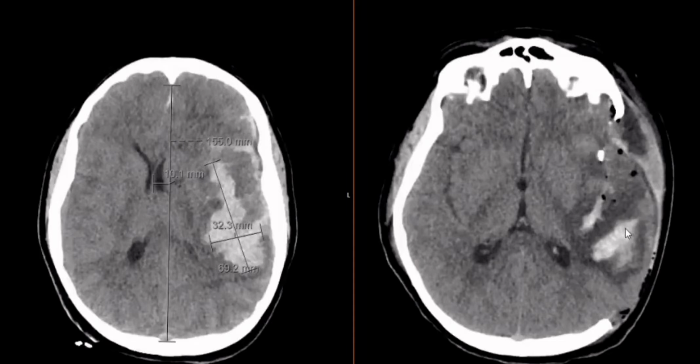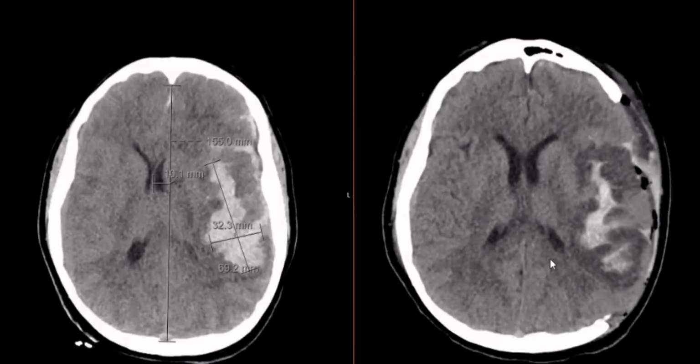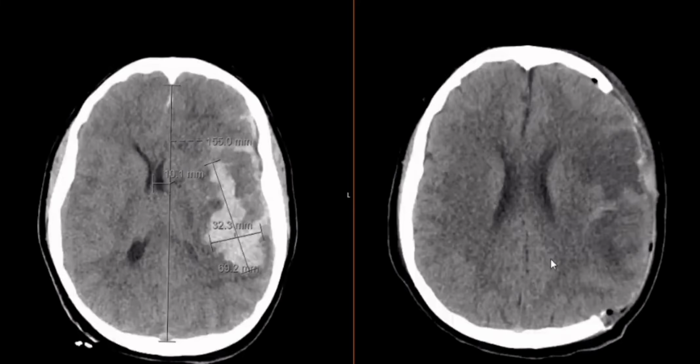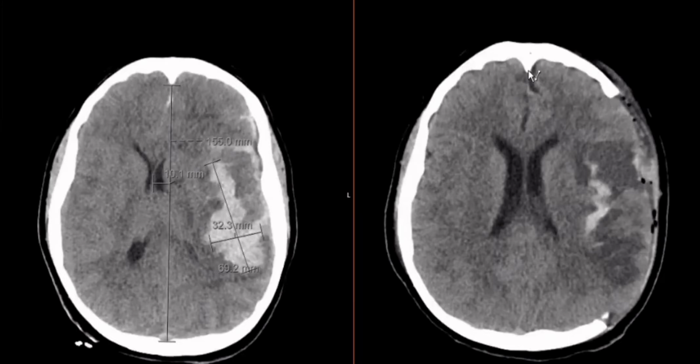You can see how much the... find the equivalent level, it's about there somewhere. See the blood and the edema and how much more edema is around that as the edema evolves across time. But if we go to about the same level, give or take, there, the midline shift is a lot better. Which, if we just draw from, yeah, we can see more of the ventricles. I have no idea where the midline is at the back there, but probably about there somewhere.